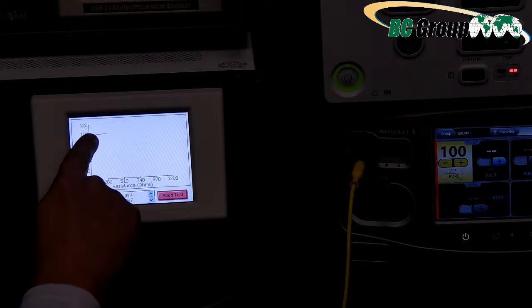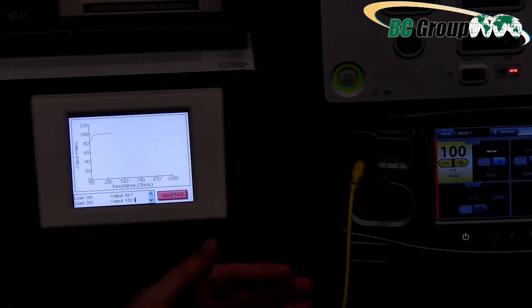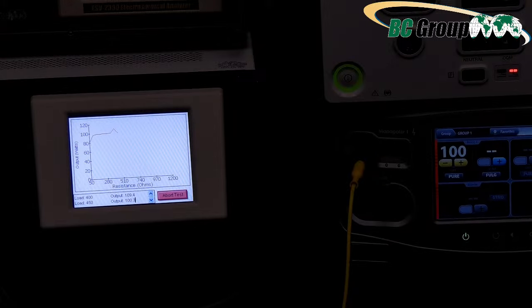That's because that is the peak or optimal output. And from there, you're going to see that this guy is just going to take an absolute nosedive. And it's going to do that because it assumes that the pad, the patient return pad, is ripping off the patient. And that is bad juju, guys. Okay? You can see it's doing a little bit of wavering because the resistance is now kind of high at 500 and some ohms. That's kind of high.